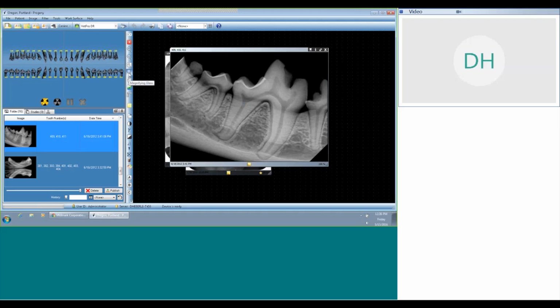We have the magnifying glass. This is a really neat tool. I'm going to click this, and I'm coming over and I'm holding my left click button down, and it gives me a magnified look of the teeth. So I really like this if I want to get a closer look at those periodontal ligaments, the furcation areas. What's that pulp chamber doing? How does that alveolar bone look in between the teeth here? All the while I'm holding my left click button while I'm doing that.